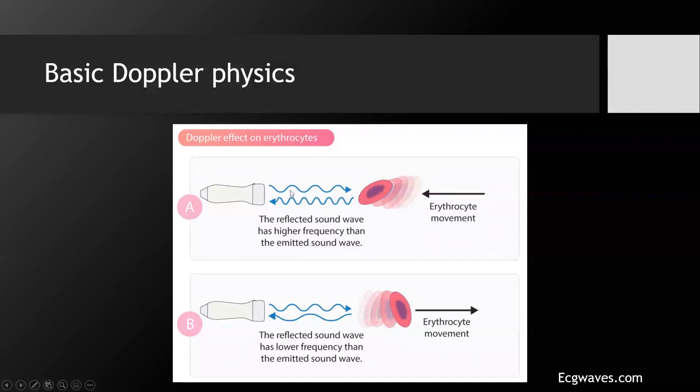Now, the speed that this travels through the soft tissue is still the same. So it's going to be represented on your echo as being at the same point. But the machine is able to detect this change in frequency, which I'll show you, and know that the blood cell must be moving towards the echo probe. Not only that, it can calculate the exact speed at which this blood cell is moving towards the echo probe at the moment that the ultrasound hit that red blood cell.